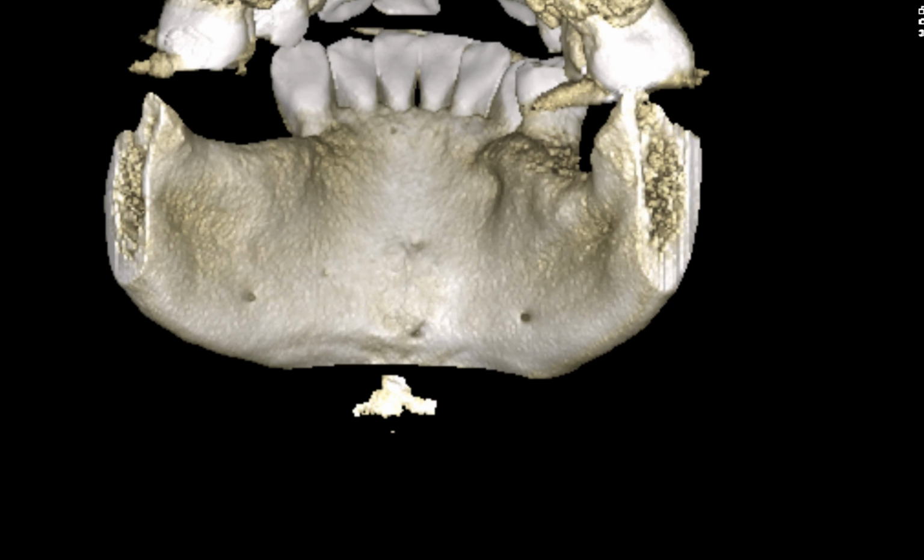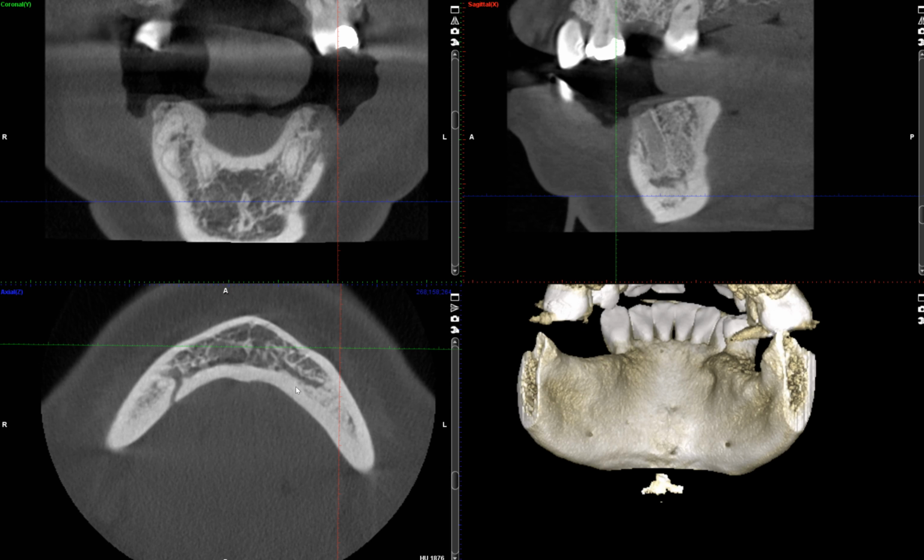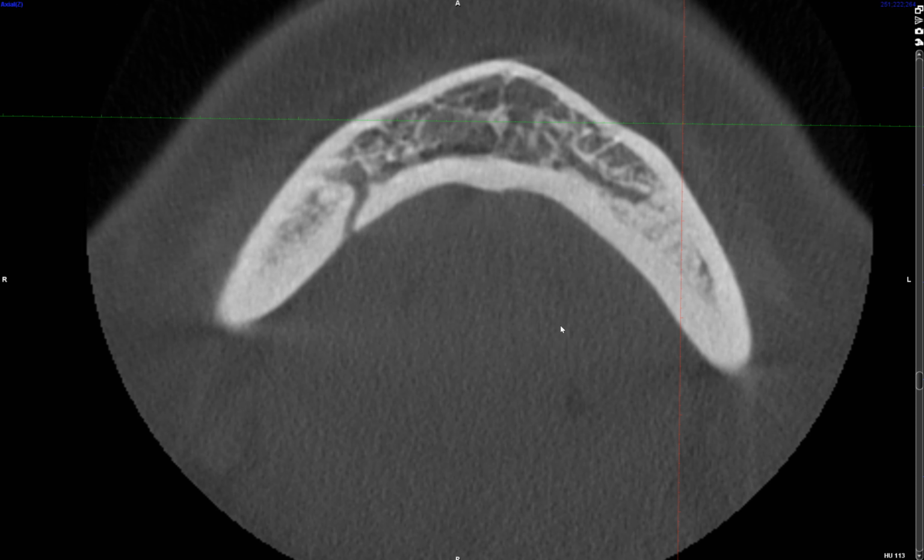Isn't that interesting? So I think the lesson to take away from this is not only that I was able to share with you the full course of the incisive nerve, but I want you to note that everyone has very unique anatomic variations, and these canals can have multiple branches that can exit through the lingual cortex, which is what happened in this example, but perhaps even through the alveolar crest, all the way to the top of the alveolar crest.